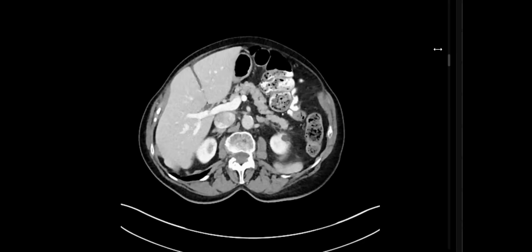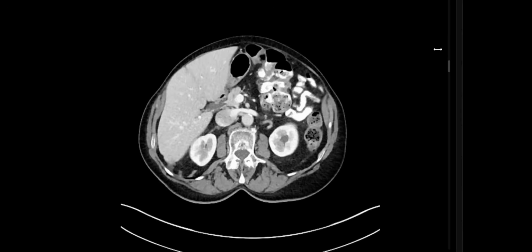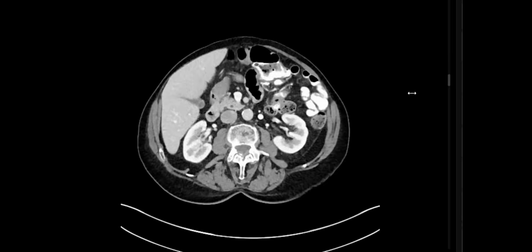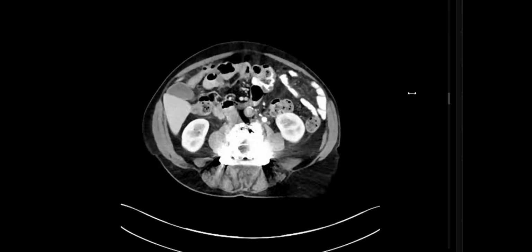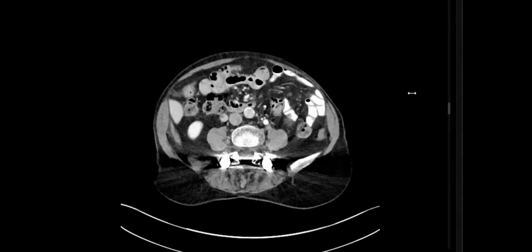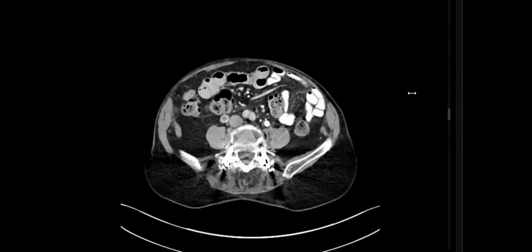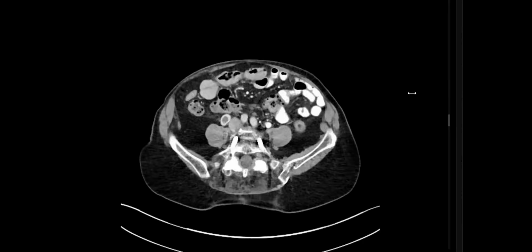No obvious hepatic or splenic lesion could be seen. There was a sliver of fluid in the right hepatic space with a few renal cysts. I could not appreciate pleural effusion in the lung bases initially. Some artifacts are appreciated in the pelvic images, likely because of spinal fixation devices posteriorly. Good.